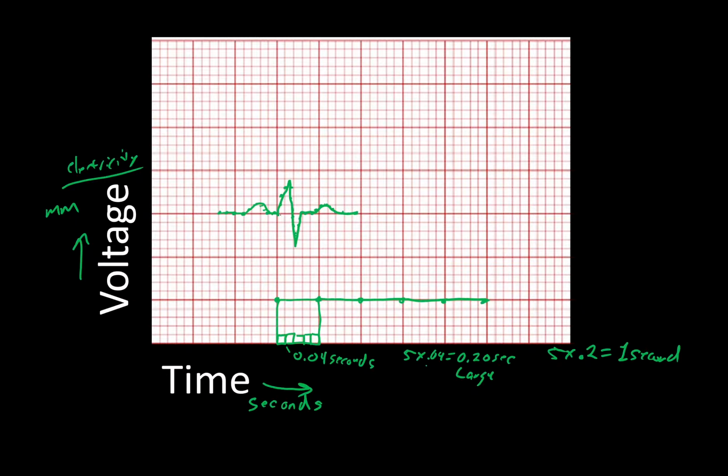And so you can see how, granted, my numbers are not perfect by any stretch of the imagination, but it demonstrates the idea that then if I have anything that looks different, I can easily say the electricity flowed away, came back to nothing, flowed towards it, less, now the electricity is flowing away, comes back, a little more electricity than is our baseline, and then there was some, and then back down to 0 again.